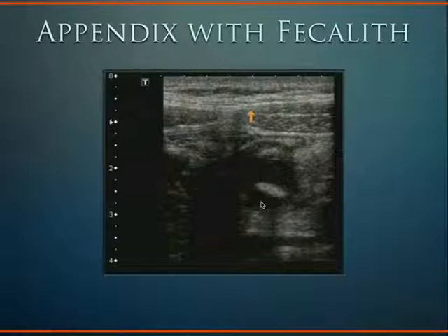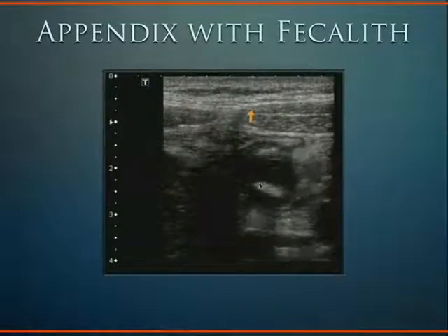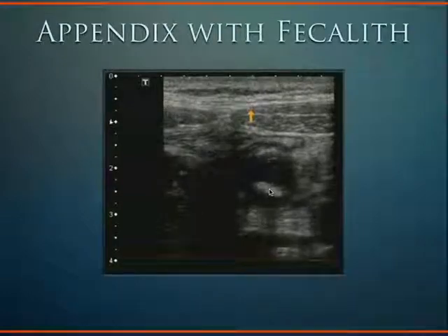and eventually you can get perforation in which pus gets into the intraperitoneal space, and then you can have an abscess develop. When that happens, perforation of the appendix, you have about an overall 5% mortality rate in patients, which is why it's important to make the diagnosis before that happens. Now, 5% is really in older patients who are at risk for developing sepsis. It's much more tolerated in younger patients, actually. But we see here this appendicolith or fecalith.